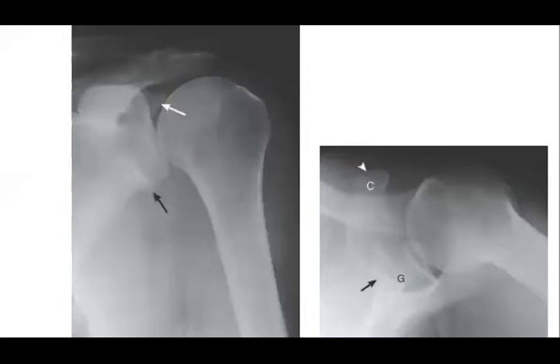This patient has a prior shoulder injury. I think he made some annotation for you. Marwa, thank you. Differential diagnosis, thank you for this good differential. Okay, Zuhair, thank you.